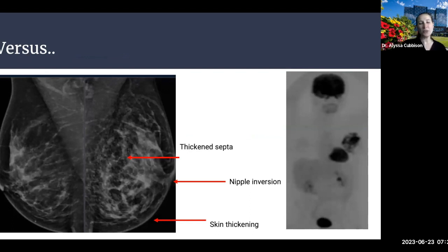So I included this, and again, it's not to educate by intimidation. Mammography can be so subtle, and we can certainly put up scary cases that force us to overcall many things. But I did think this was a good case to highlight because it shows the juxtaposition of what I'm trying to say: this was a malignancy, but there are other secondary findings to explain that.